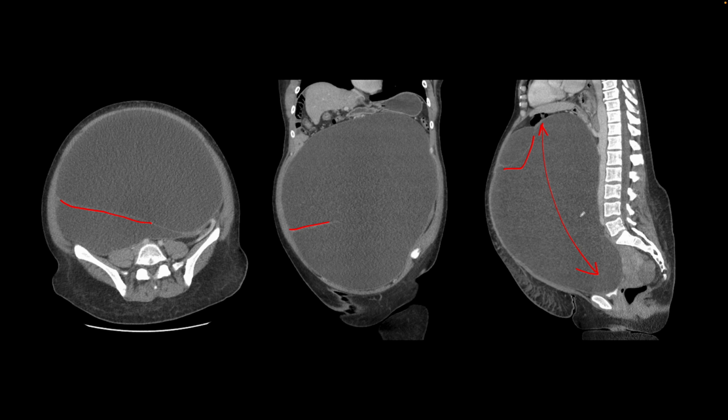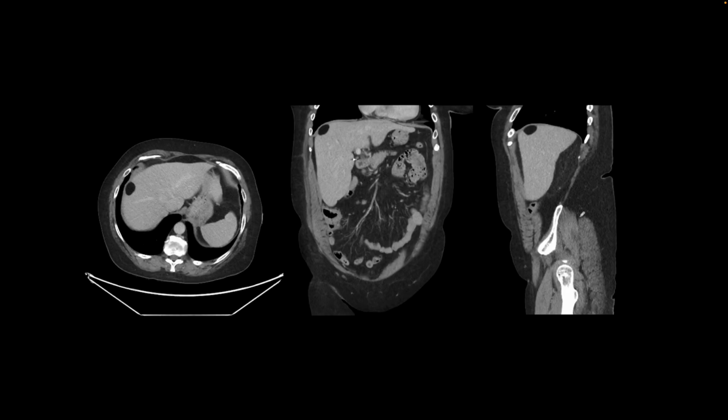malignant ovarian tumor. Ovarian tumors commonly are surface epithelial tumors, and they present like this with complex cystic masses that distend the abdomen and pelvis. The suspicious features that we are looking for to diagnose malignancy would be multiple septa, thickening of the septa, mural nodules that show enhancement, and signs of metastatic disease such as lymphadenopathy, ascites, or carcinomatosis. This one turned out to be a mucinous cystadenoma, which is a benign tumor.